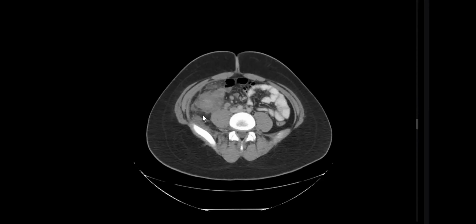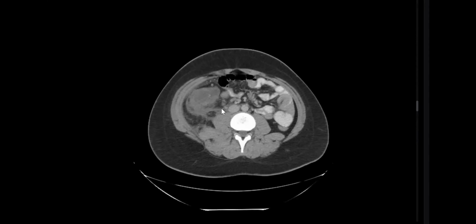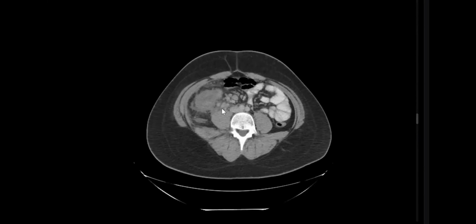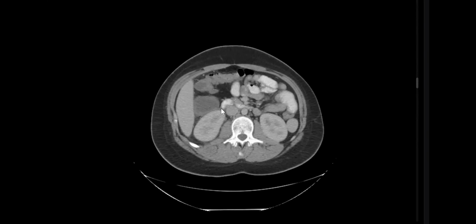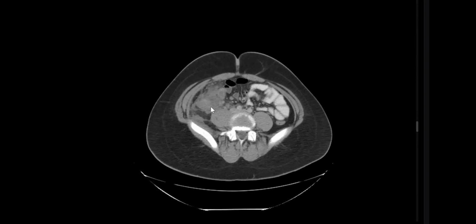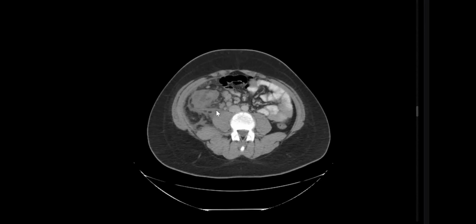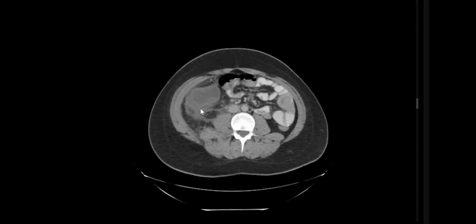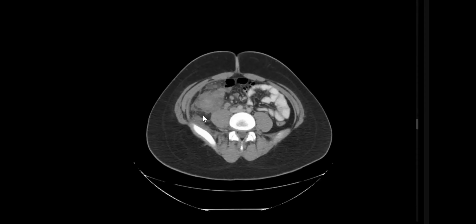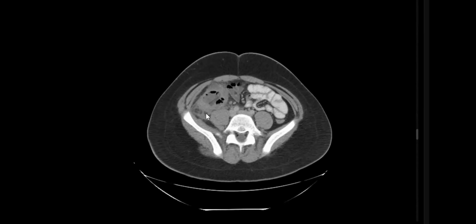I'm looking for the lymph nodes. I can find a few, multiple adjacent lymph nodes. As the patient is presenting with acute abdomen, this is likely a case of appendicular abscess with phlegmon formation, because I cannot appreciate the appendix separately. Mild associated thickening of the cecum is also seen, which is reactive. I would also like to see the lung window to look for pneumoperitoneum.